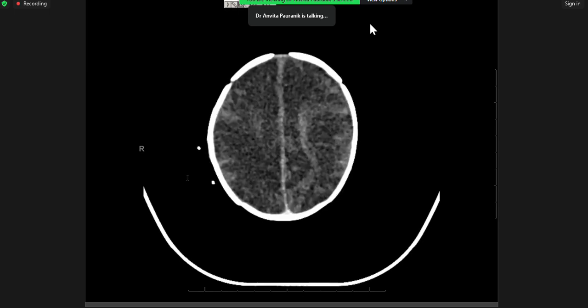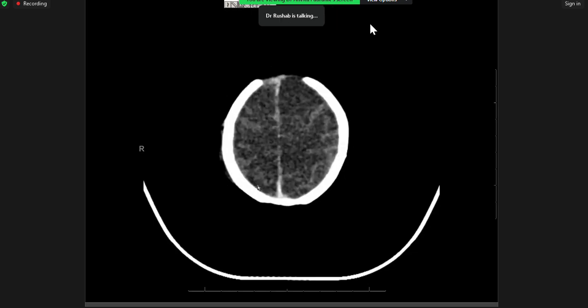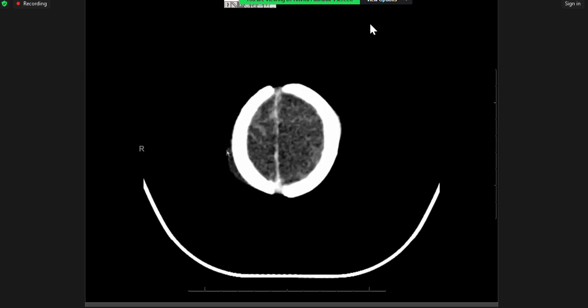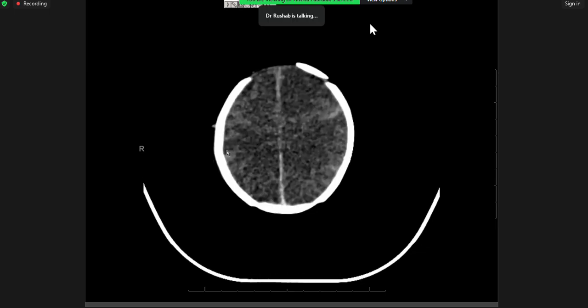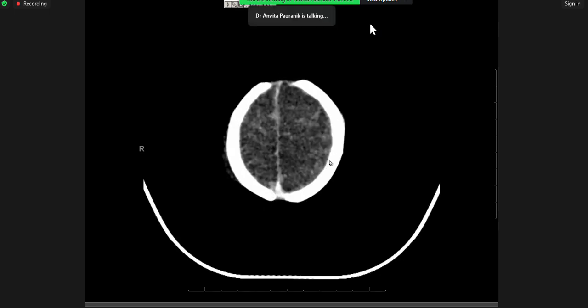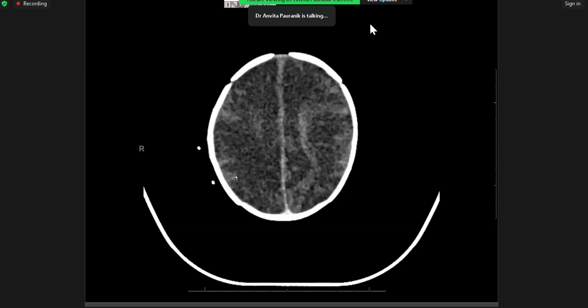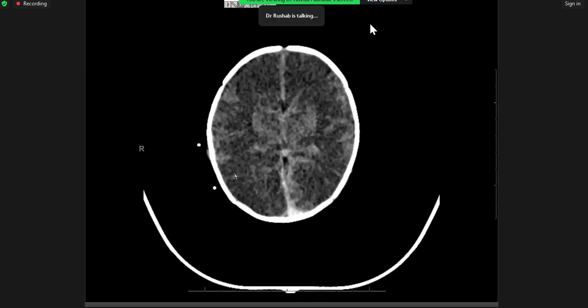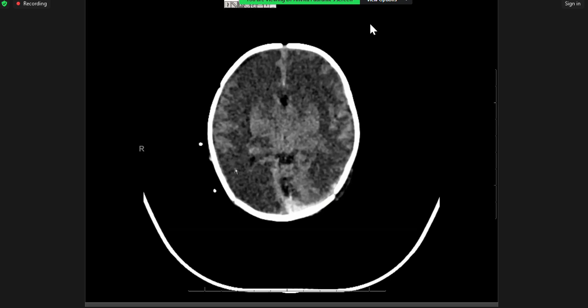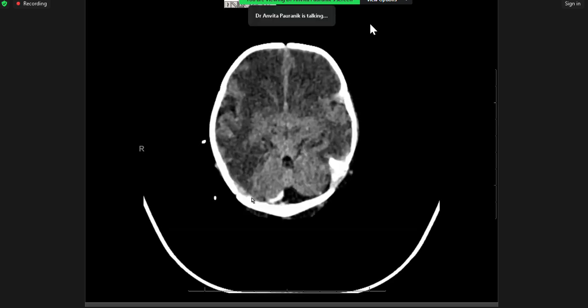So how do you describe this? Is this hemorrhage? What is this high density? Ma'am, linear hyperdensity along the falx and few curvilinear hyperdensities along the sulcal spaces in the parietal and occipital lobes. Okay. So if I tell you this is not hemorrhage, what else can explain this high density? Venous congestion, ma'am. Okay, and any other better descriptor? Because you're seeing so much global edema, right?